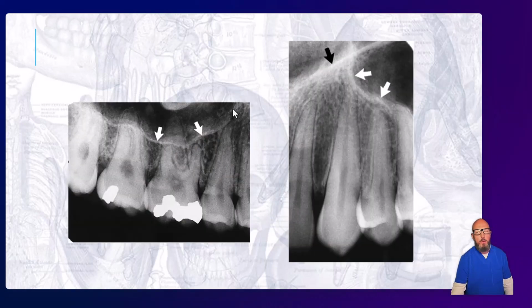All right, you probably know this one, the maxillary sinus. Sometimes that dips down in between the roots of the teeth. Sometimes it's more hypoplastic, meaning small, and it doesn't really go down between the roots of the teeth. So there's variation to this, but it should have a nice, well-defined corticated outline as we see here.